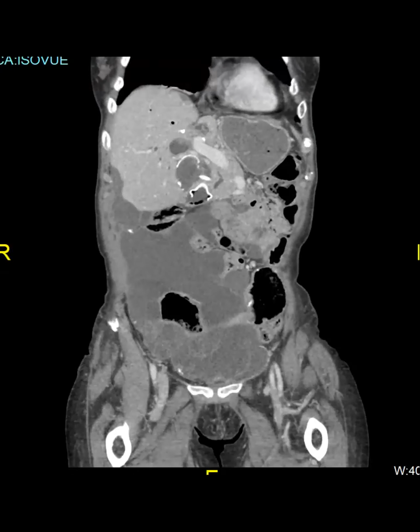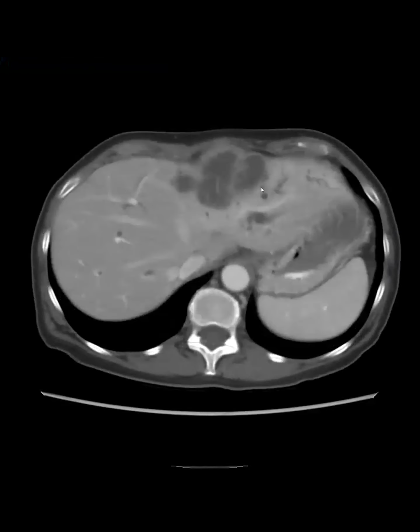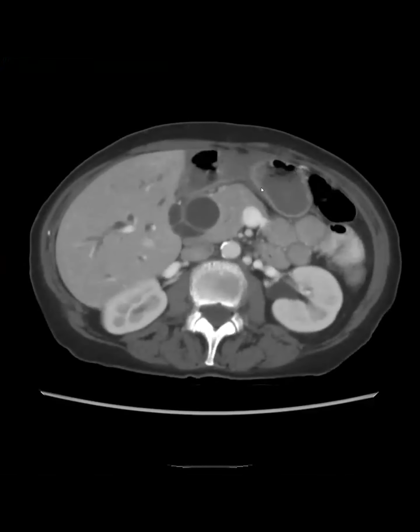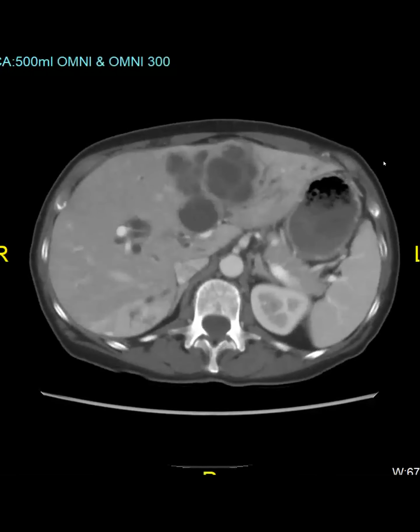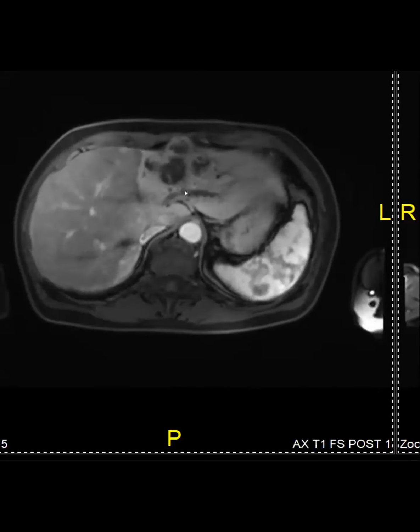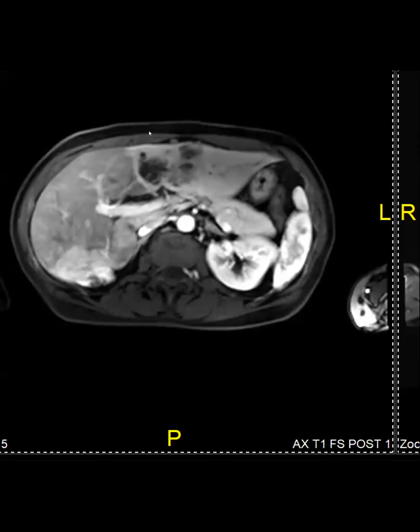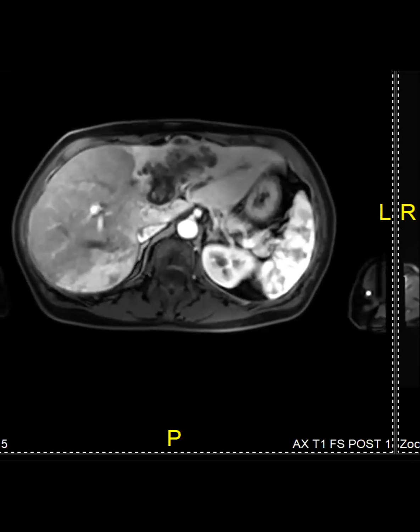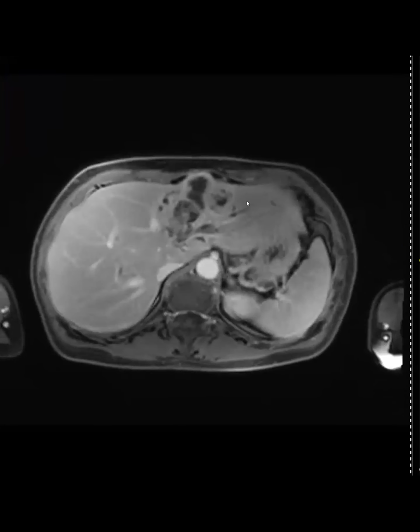Yeah, I mean, something along the cholangial spectrum. IPNB, no, I agree with the findings. It's just, I don't know that I would give that as an isolated differential, right? It could be intrahepatic cholangio. The one thing is it's so filled with mucin that cholangios usually don't expand the ducts like that, or the common bile duct. And this frond-like enhancement inside right here, I think this is probably the most extensive example that I've seen, and this is not a common appearance for intrahepatic cholangio.